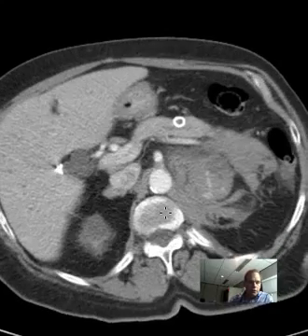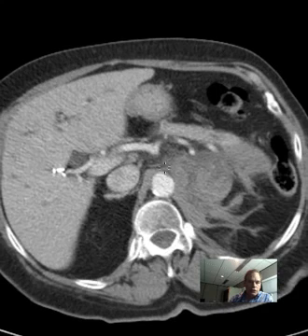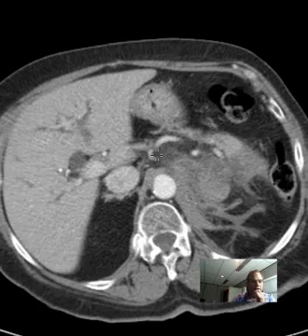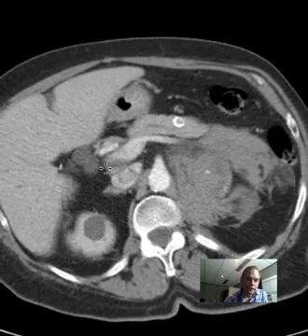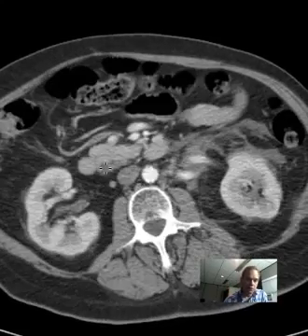which is right here, off the aorta, you see it branches and it gives off the hepatic artery and the splenic artery. It also gives off the left gastric artery, which is smaller, and it's probably that little doohickey there. So this is the hepatic artery. That's one thing that goes to the liver. What else goes there? Well, the portal vein has to go there. Where is it coming from? From the mesentery and the bowel.